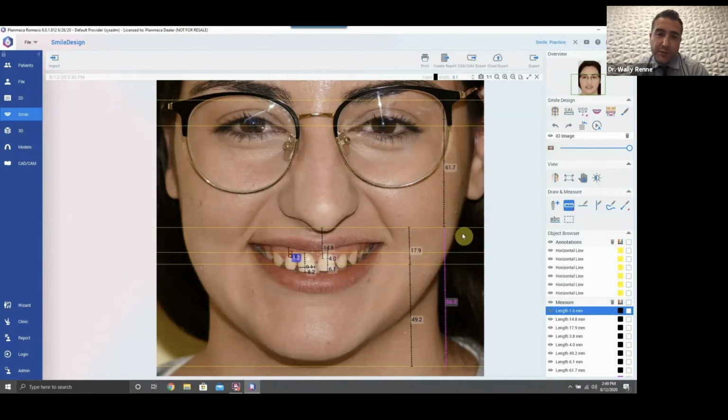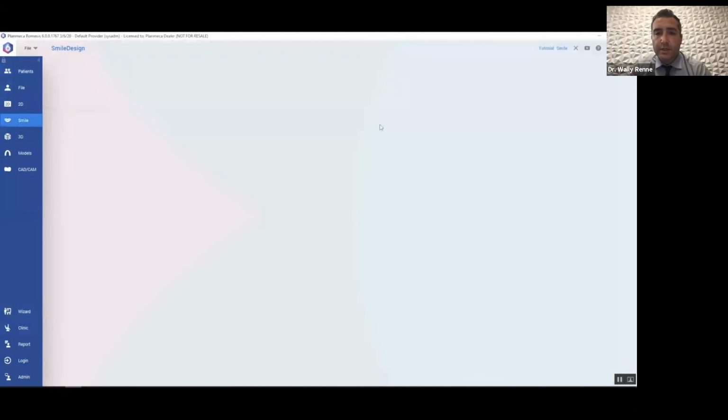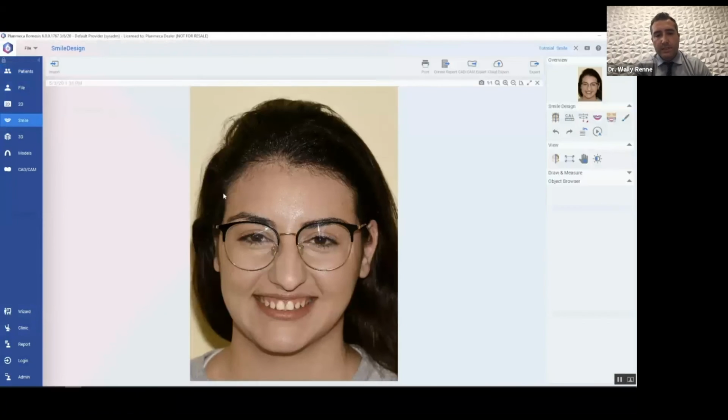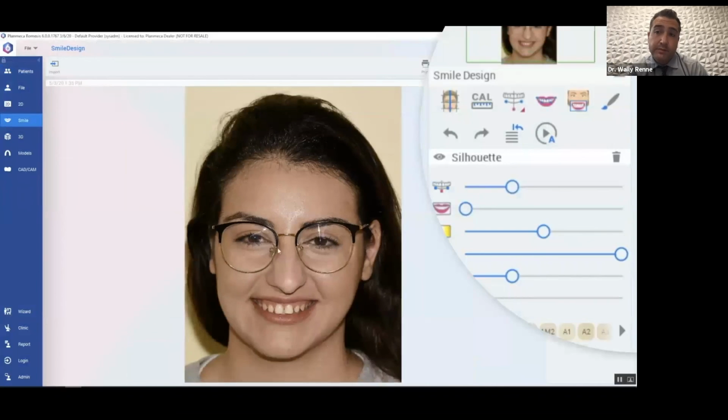So really we focused on the face at first to figure out what's going on. We've diagnosed she has a short upper lip. She has actually a deficient maxilla, not a vertical maxillary excess. And she does not need a Le Fort 1 osteotomy to move the maxilla up. If anything, we have to try to go the opposite way with this. So let's keep going and see how we go on to now the tooth silhouettes, because that is just half of the equation. So now we're going to start with the smile shot. Okay, so last time we started with the repose.